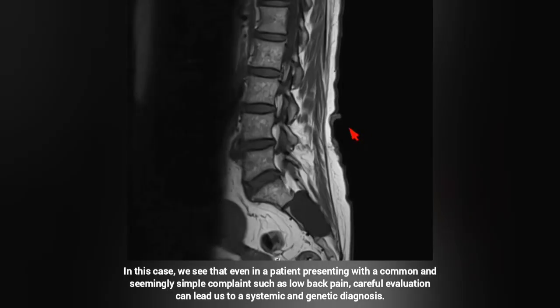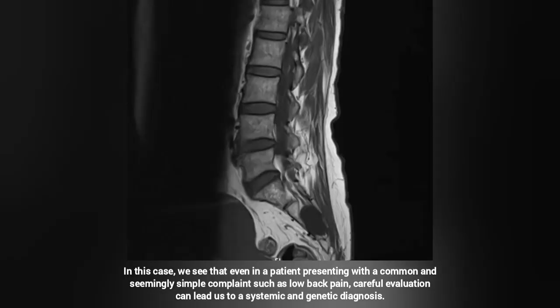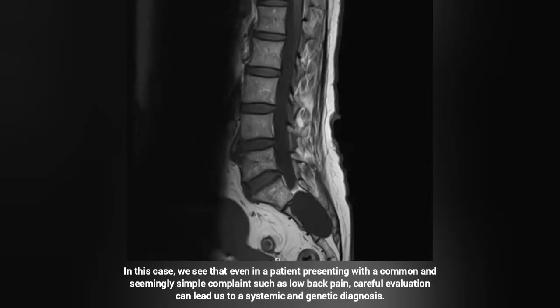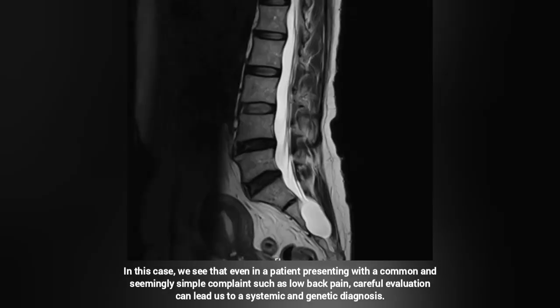As we continue to examine the images carefully, we observe multiple nodular lesions in the subcutaneous tissues. At first glance, they may appear incidental, however, their multiplicity is significant. Now I move on to the T2 weighted sagittal images.